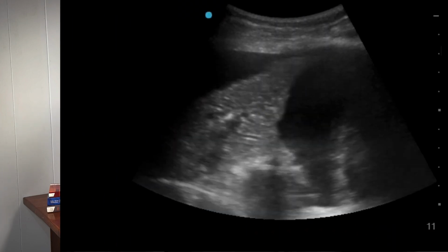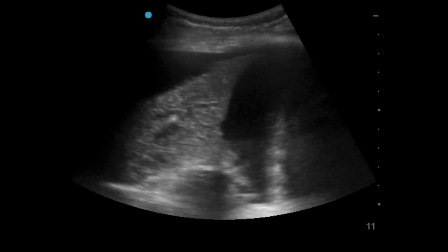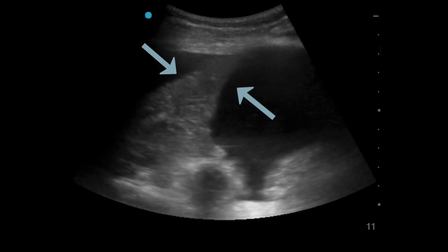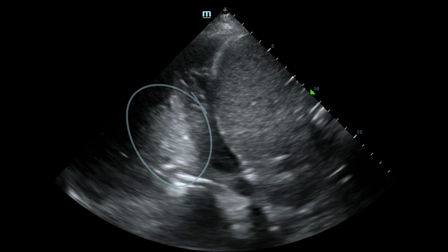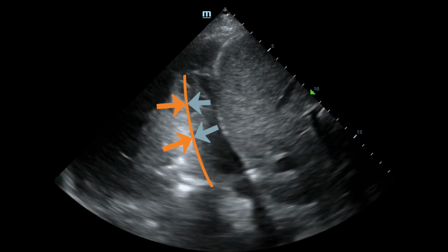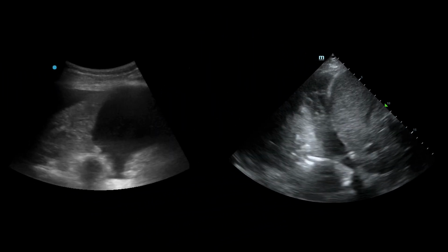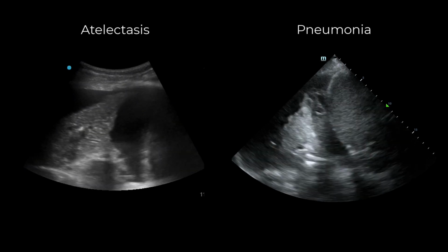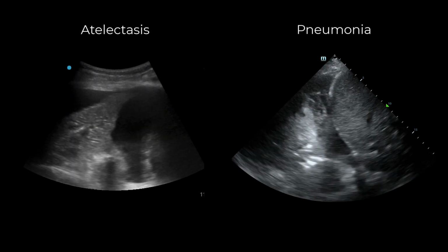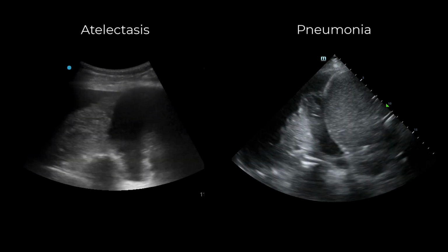lung. If there's pleural fluid around the consolidation, we can use the effect of the pleural fluid pressure to help determine the cause. The way I think about it is that atelectatic lung is a soft tissue mass that is easily depressed by the pleural fluid, whereas an infectious consolidation is filled with non-compressible pus and resists the compression by external fluid. If we see a floppy, concave consolidation, sometimes called a jellyfish sign, we're seeing a lung that's being compressed by the fluid around it and suggests atelectasis.